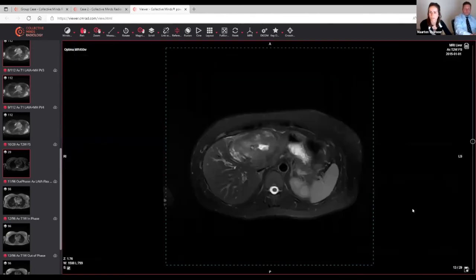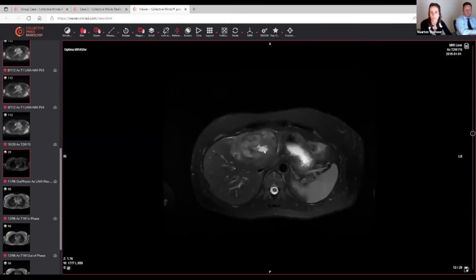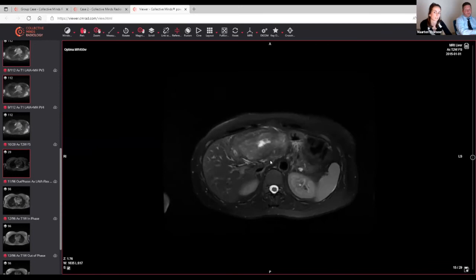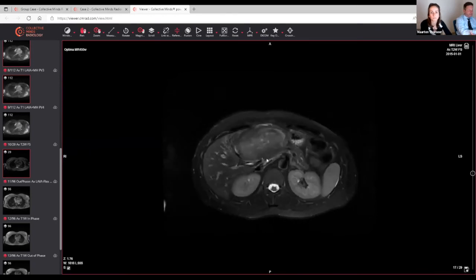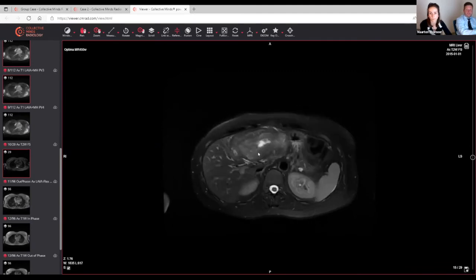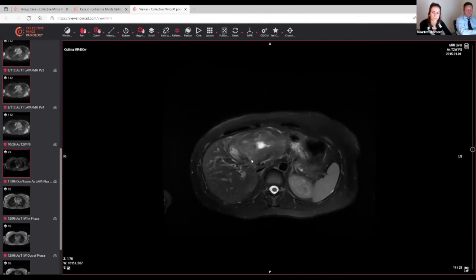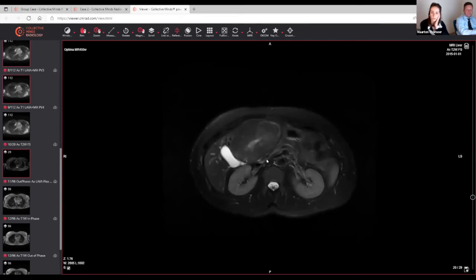But if you look at the T2, it looks different from the previous case, because I think this is a heterogeneous lesion. Also heterogeneous, yes. But it has no pattern, I don't think there's a pattern here. And there are different areas in this lesion. If you hear somebody saying different areas, you have compartmentalization, and compartmentalization can be mosaic pattern or nodule in nodule, for instance. And these are two hallmarks for HCC. And do you see nodule in nodule here? Yeah, I think this area is a different area. And there's also a nodule in the nodule possibly. So this is a very heterogeneous lesion.